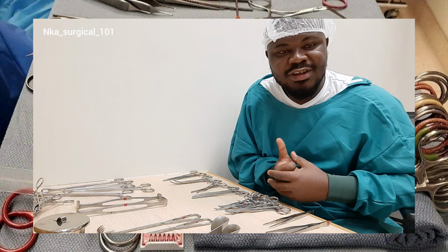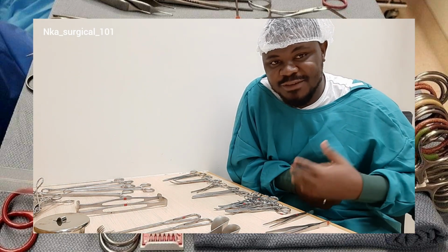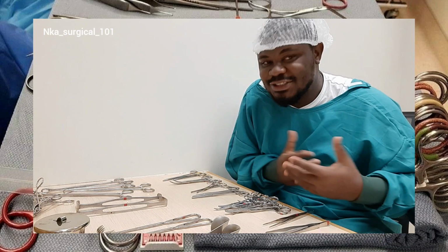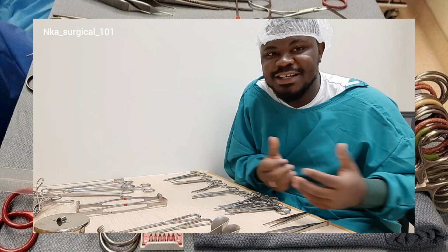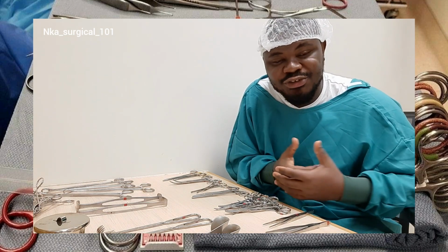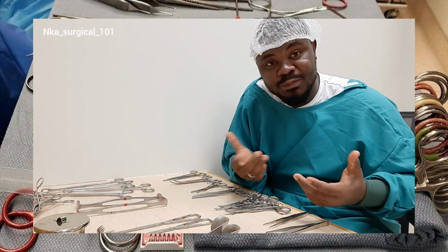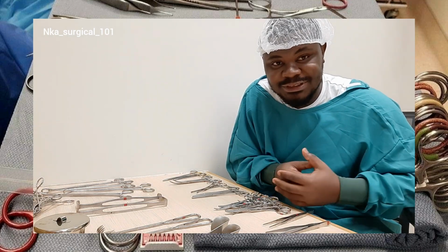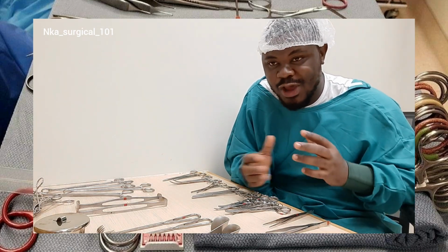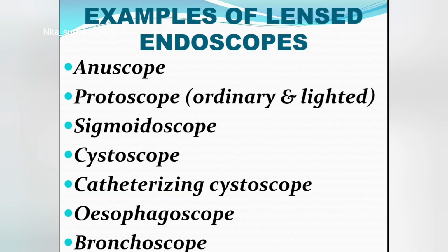The sixth classification of surgical instruments is the viewing instruments. Just as the name suggests, viewing instruments are used to view during surgery. Examples are the speculums and the endoscopes that are used for surgery. They all help us to view one way or the other during surgery.